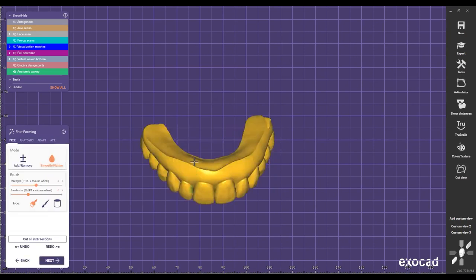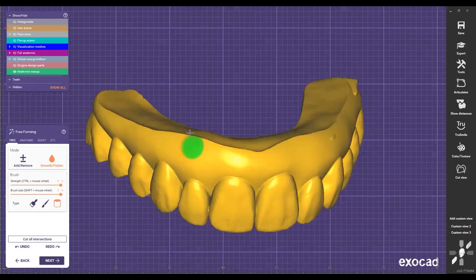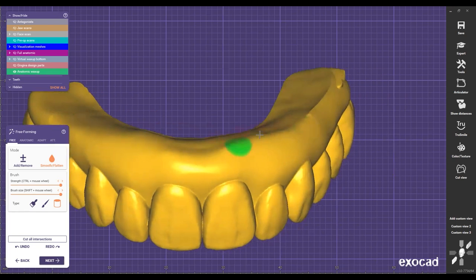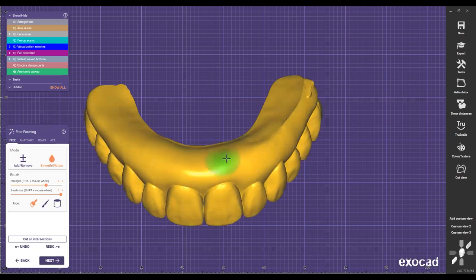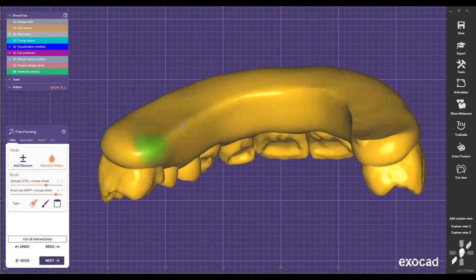Then I can just start creating a nice ideal shape here, because remember, they're going to cut bone, and I just need to make a nice ovate pontic shape here. I want to leave it ready to close to how the bone is going to be, and I need to make it flat and even, because remember, when we do these cases, the surgeons make a flat cut on the bone. So that's why we need to make this flat, because we cannot leave it bulky or anything like that, right?